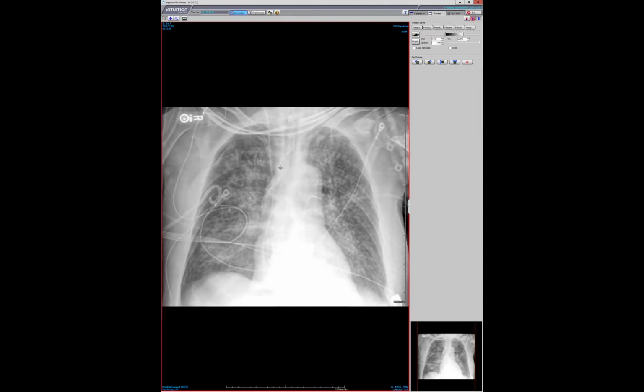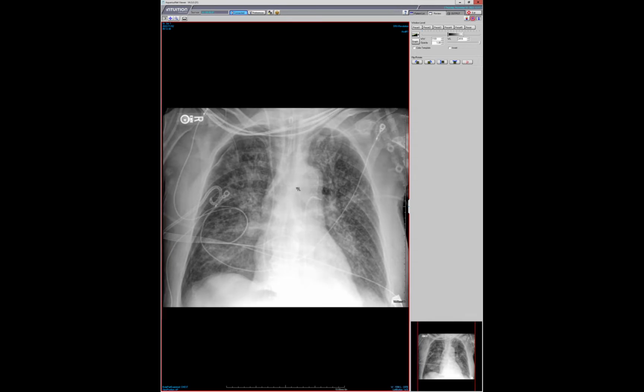Have you seen lungs clear that quickly? I've seen opaque lungs like that in patients on ECMO. And typically in that context, when the lungs become white, and they can become white very quickly, it's because they are using very, very small tidal volumes, so they're simply not inflating the lungs.